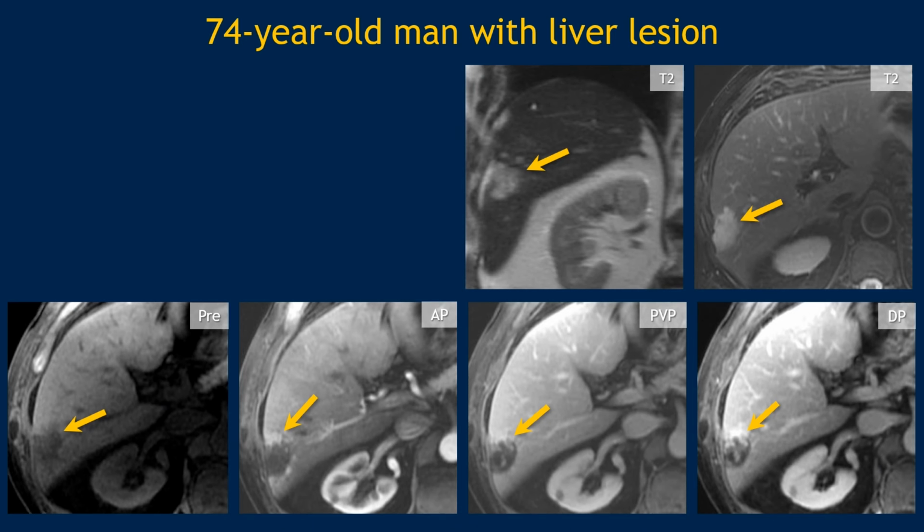Here's a 74-year-old patient, T2 hyperintense lesion. On T1 pre-contrast, the lesion is hypointense. This has peripheral enhancement, rim and not nodular, although there may be a focal area of nodular enhancement, kind of filling in. The reader said, well, this is a 74-year-old. I don't have a prior study. Yes, there is no underlying liver disease, but I'm a little worried about this lesion. So this was biopsied, and it was a sclerosed hemangioma.